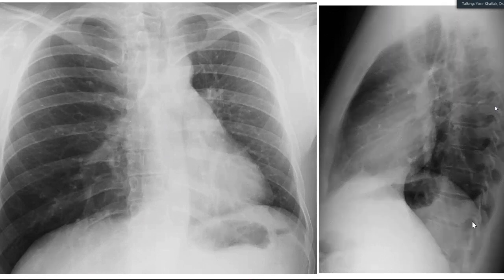Okay, let me explain the case further. In the exam, you have to stick to your preliminary findings, and on the basis of that, you have to come up with further steps. Whatever you say should be based on that. Volume loss because of what? You mean atelectasis. Do not leave this. If you say atelectasis, you have to take it further. Atelectasis because of what?